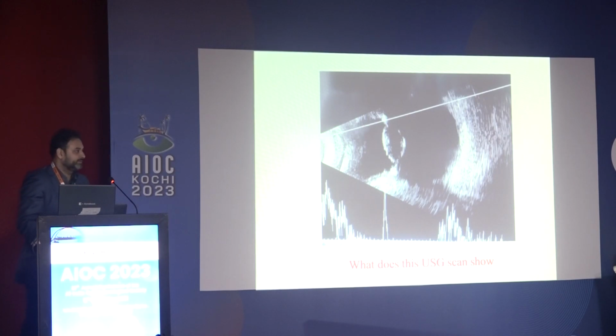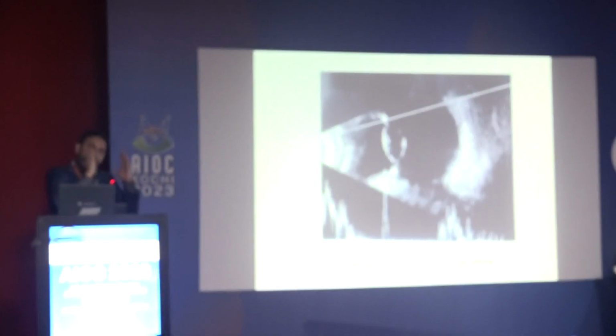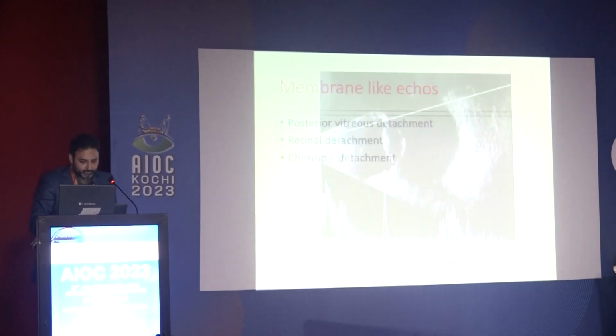I'm going to quickly finish. Again, with the ultrasound, you place the probe there and, based on the wavelength, it tries to image a part of the eye. If the eye is outside, so this patient had an anterior staphyloma, the eye was there. You image the eye, and the ultrasound depth penetration is going to be the same. So you'll be able to see a lot of the AC, all of the lens, and all of the vitreous, right? Tough ones, just trying to open your mind a bit.